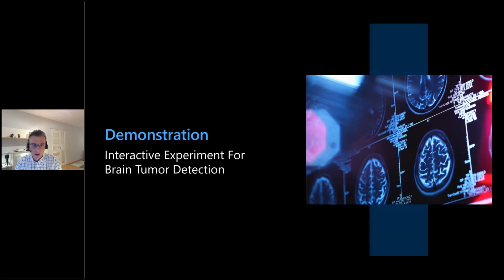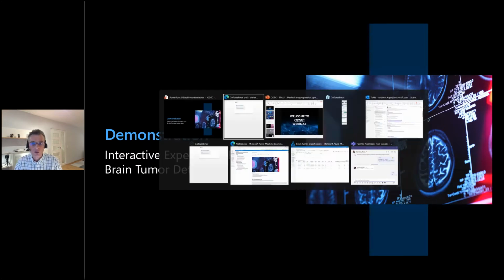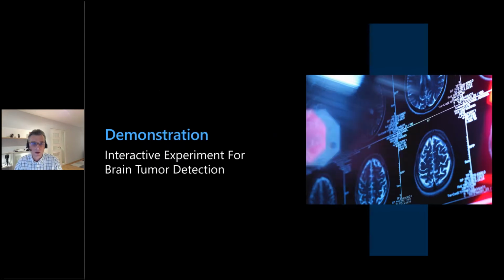And with that, I would like to start with the custom experiment for brain tumor detection. And let me actually switch to my notebook experience so you can see it here. Let me quickly switch.